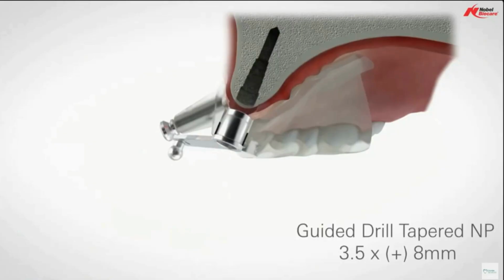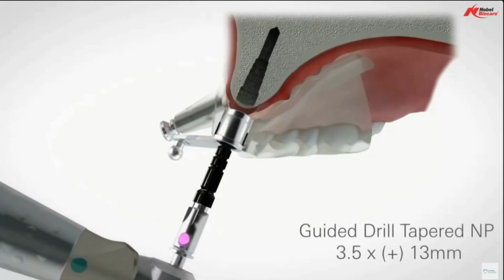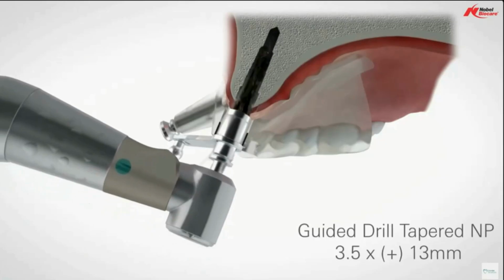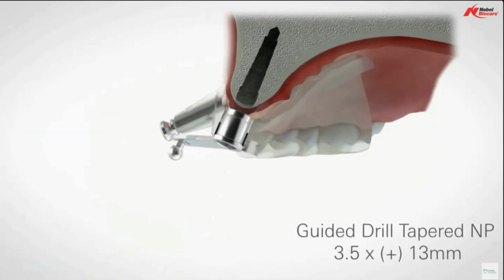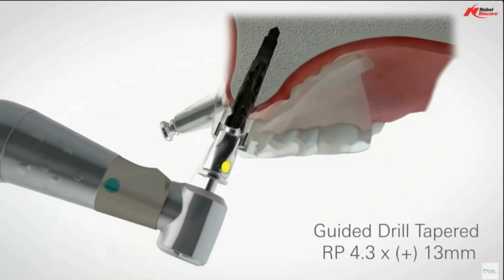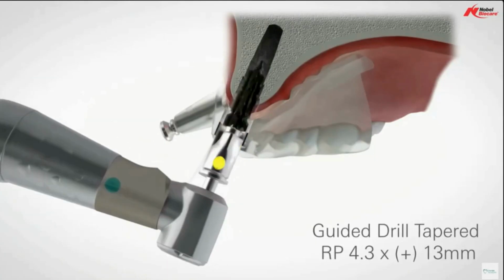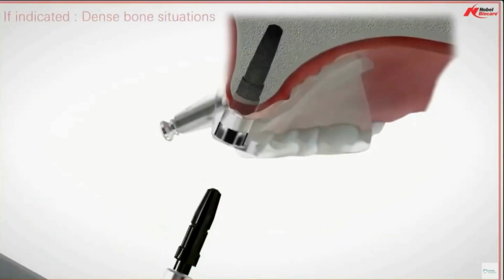Depending on the implant system you're using, this happens to be a tapered implant. Most implant systems actually use straight drills, but you're just stepping up gradually, and the target is to have an osteotomy a millimeter smaller than the implant size. That way you can actually compress the bone a little bit when you place it. You'll see with this drill, the final drill actually has the same diameter as the sleeve, so it dictates where we're going to place it.